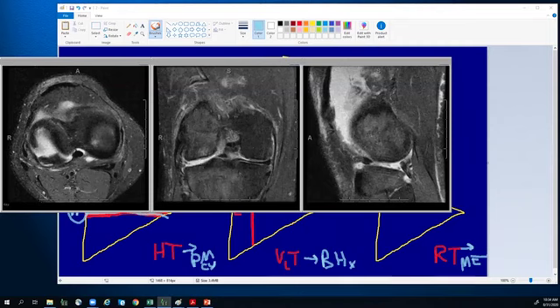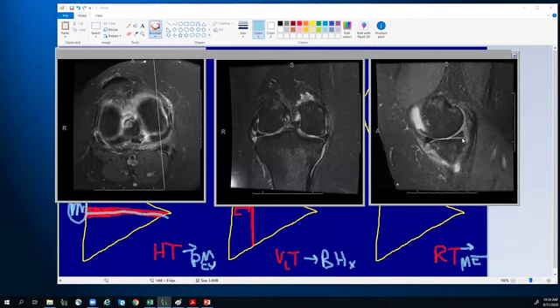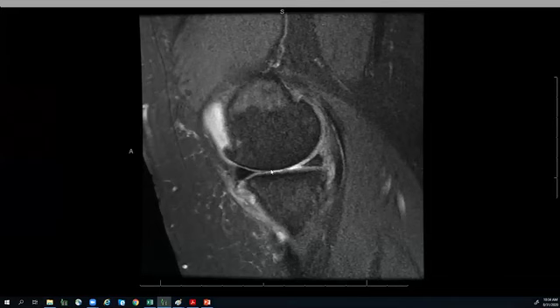Now, a special type of radial tear, which I think you need to be aware of because these are quite common. You're going to see these, and I'll talk my way through this case since I'm alluding to it. This is the idea of a posterior root tear. A posterior root tear is basically a radial tear that's occurring at the posterior root attachment of the meniscus. In this case, I'm going to be showing what it looks like involving the medial meniscus.